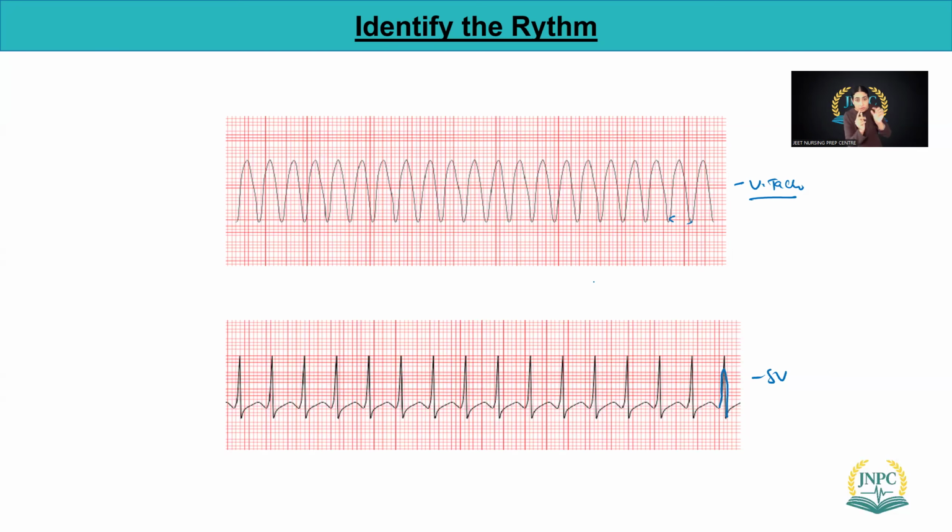It's storm-like, but look at those small boxes. How many of them? 1, 2, 3, 4. Sometimes 4, 5, right? So the QRS could be 4 to 5 small boxes. But in SVT, it was 1 or barely 1.5. So that's a major difference between VTAC and SVT.